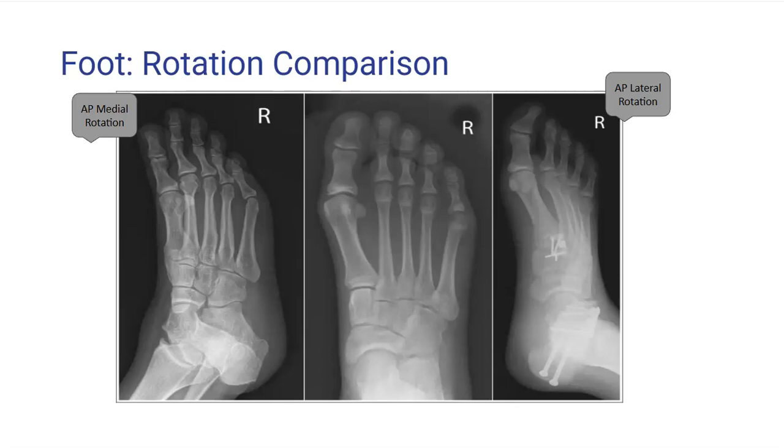When there's medial rotation, there'll be decreased superimposition of the metatarsal bases. Closure of the medial and intermediate cuneiform joints is demonstrated, and the talus moves away from the calcaneus. This results in less than 1/3 of the talus superimposing the calcaneus.